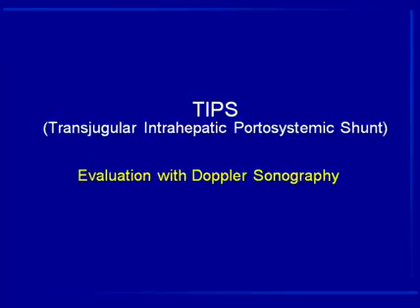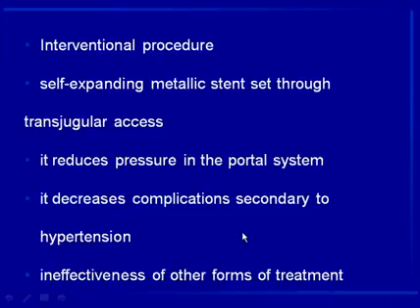Transjugular intrahepatic portosystemic shunt, evaluation with Doppler sonography. TIPS is an interventional procedure using a self-expanding metallic stent set through transjugular access.